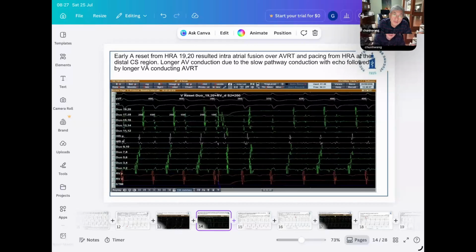Maybe at the very first tachycardia, when they diagnosed the 12-lead ECG, you thought the patient had short RP tachycardia. The timing is almost the same as this. So based on clinical evidence, maybe this patient has a tachycardia with a single decremental conducting pathway, maybe with different exits. That's quite possible. I cannot prove that 100%, but I think that's what it is. Because of your post-ablation EP study, there was no dual AV nodal physiology, no jump.